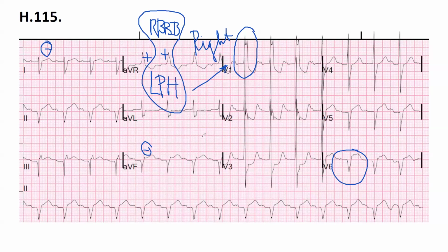Look at the Q wave. Can we see a pathological Q wave? No. Especially here, you do see an ST elevation as well, and here as well. So we do see Q wave in lead 2, lead 3, and AVF, and ST elevation. So that means an MI, an inferior STEMI.